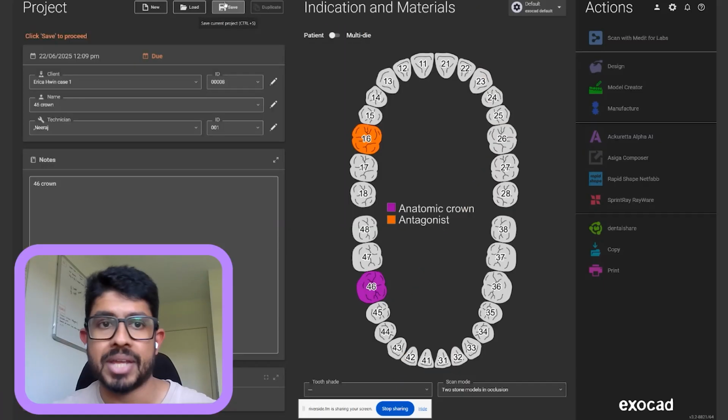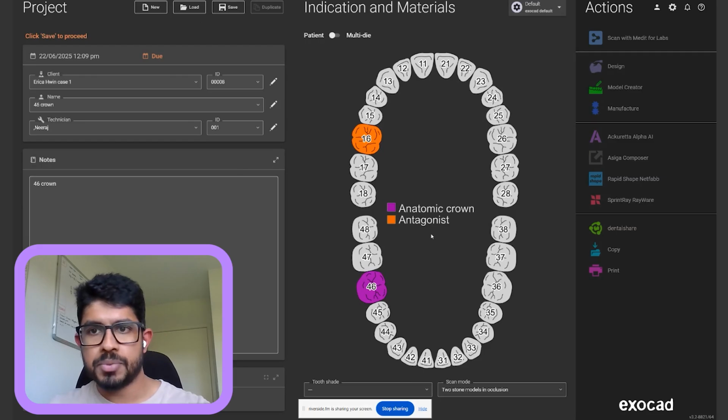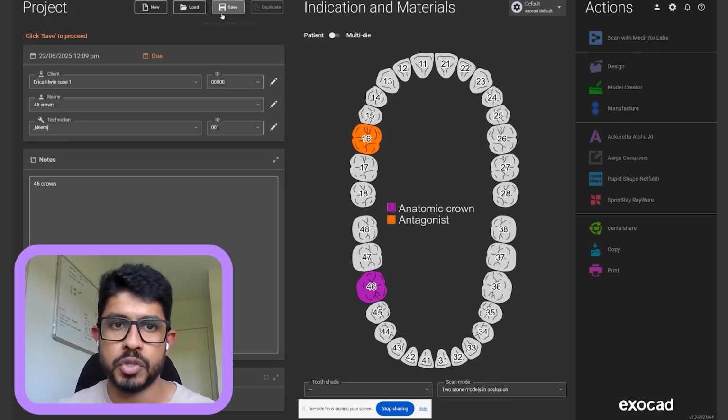Yep, and as we go through the design, I can show you at what step that comes in. Okay, cool. So I've selected my prescription. None of these options pop up. That's only because you have to hit save, for those of you who don't know. So once you hit save, this was another thing.